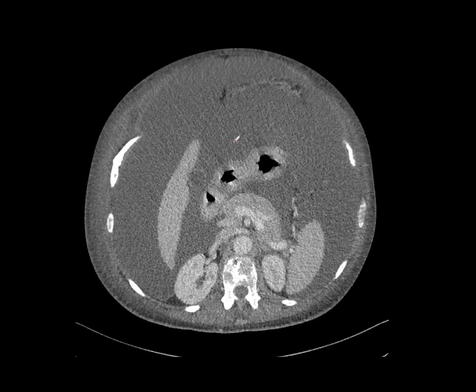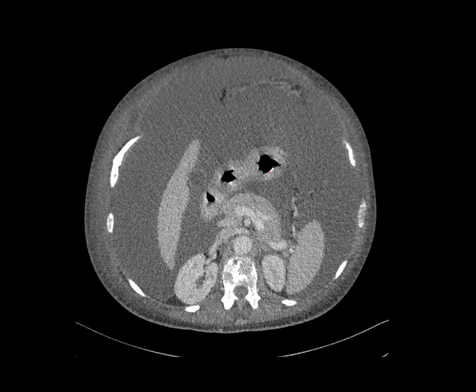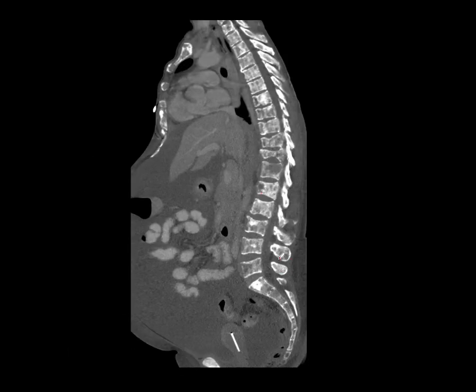So this patient here, we've identified some omental tumour, we've identified that ovarian mass here, and when we look at her spine on the CT, you can see here extensive sclerotic metastatic disease with a couple of vertebral body collapses. As I said before, this is a very unusual pattern for primary ovarian carcinoma, and in fact this was metastatic breast cancer.